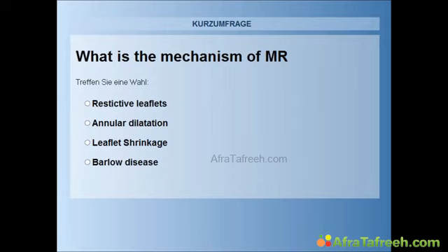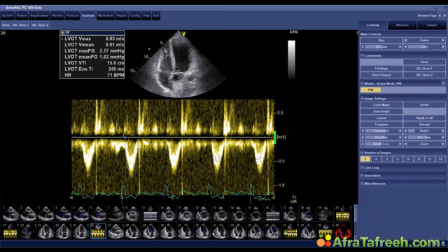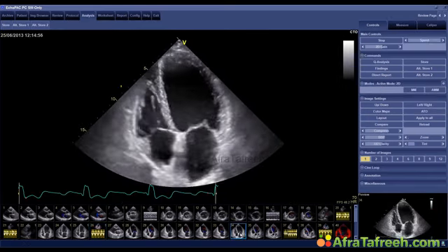Okay, so most of you think it's annular dilatation. You guys are actually right. Let me show you the images again, and then we'll take a further look also at his TEE study.